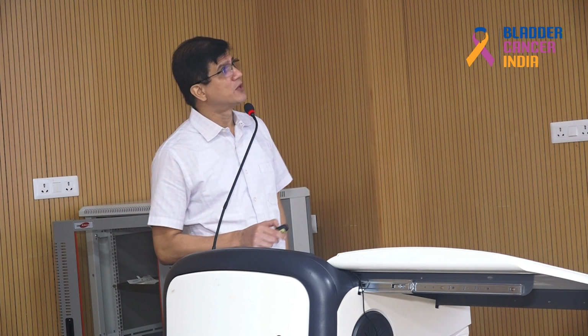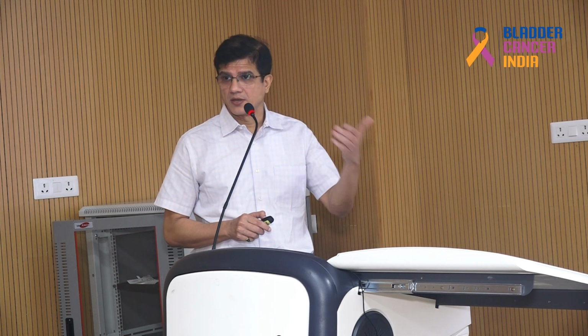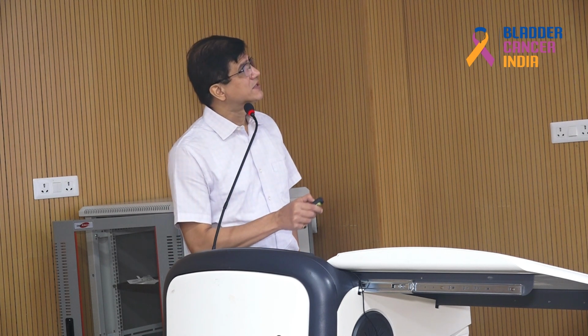So, interruption of the low SI line, in case it is there and it has not crossed beyond the muscularis propria into the perivesical fat, then it is 4, and if it has crossed into perivesical fat, it is 5. If it is that, then in that case it becomes a T3 lesion. Again, all algorithms say the same thing, whereby we arrive at the grading, where SC1 is structural component, SC1, 2, 3, 4 and 5, the one which we discussed, with permutation and combination of contrast enhancement and diffusion weighted images. Again, with these things, we arrive at a scoring.